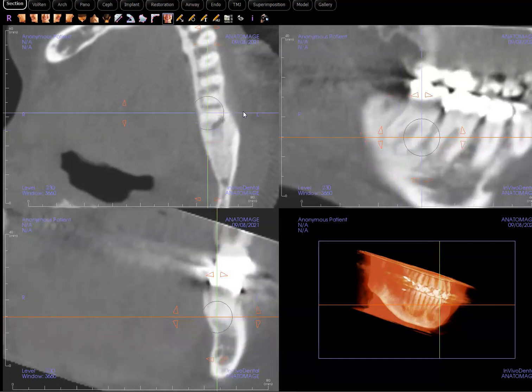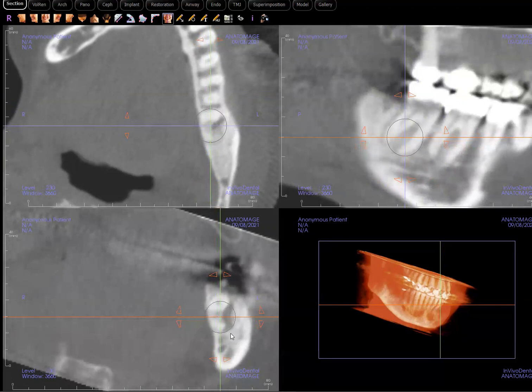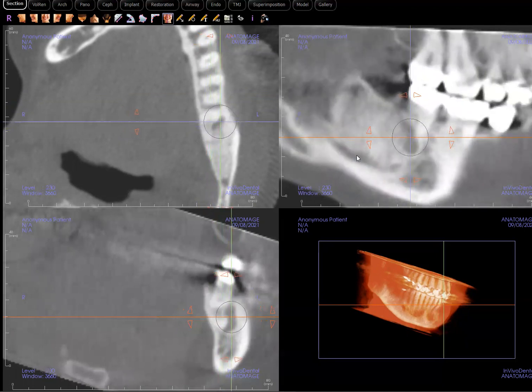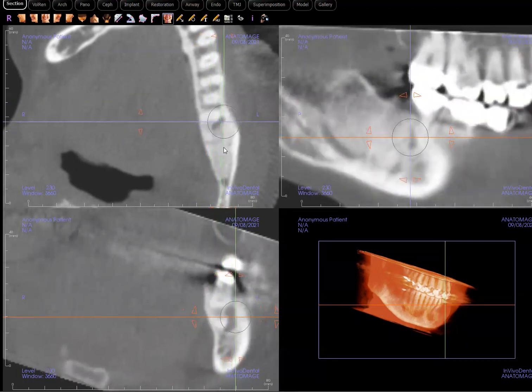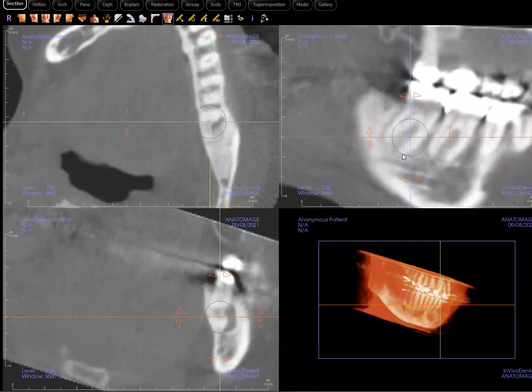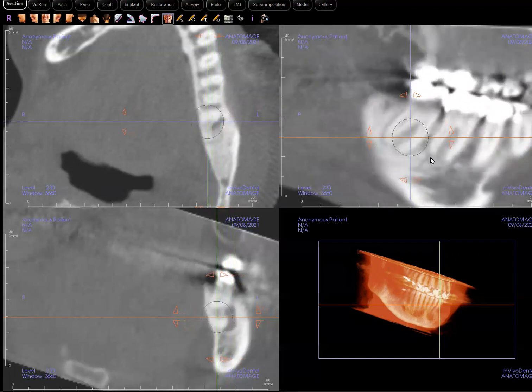I didn't even notice that when I looked at the scan previously, but as I was recording it, I noticed this neurovascular channel that's arising from the main branch, inserting itself into this root. Okay, visual of 18 and also 19. That's very, very cool.